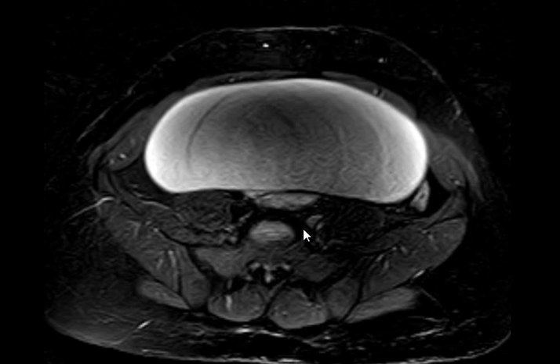Post-op, we should comment that it was serous, because they are different. It was serous ovarian cystadenoma. There is no papillary projection, no solid mass, of course no malignant features. If there is ascites or papillary projections or post-contrast enhancement, all of that goes in favor of a malignant lesion. Its size, of course, it was serous cystadenoma.